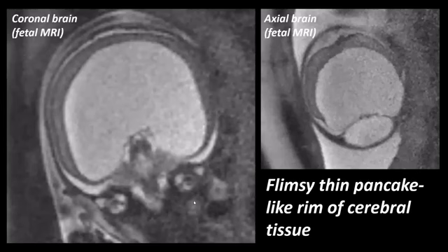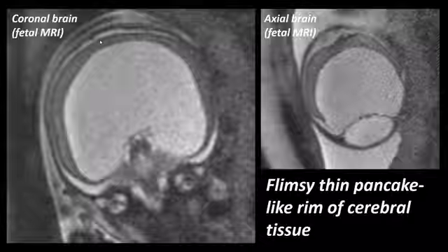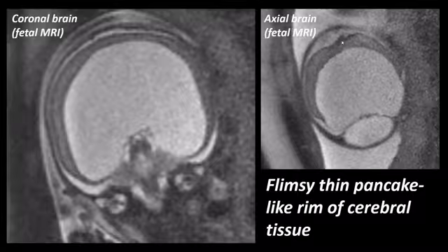Well, maybe it's better seen in these very extreme cases that were diagnosed prenatally. This is a fetal MRI, and it's also called a pancake brain sign because we basically just see a very thin rim of residual brain lining the skull. It's as thin as a pancake, which is why it's called the pancake brain sign.